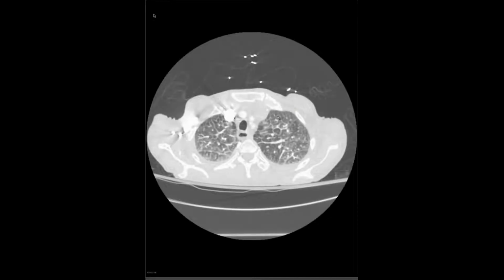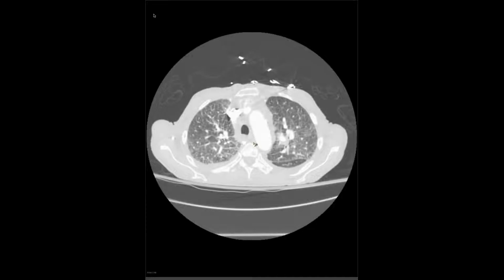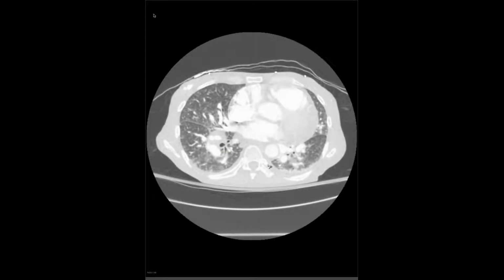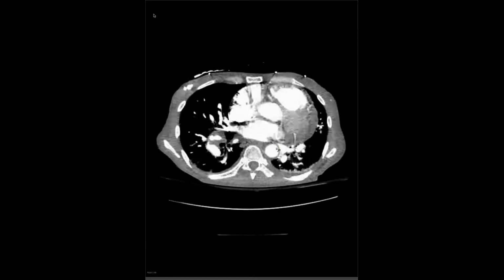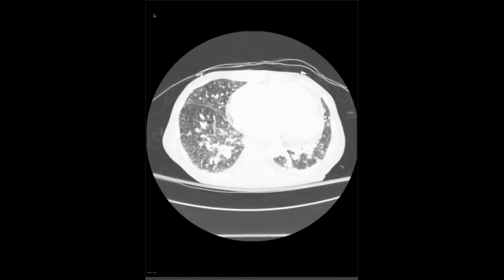And this is 2020, and she's been treated for a couple years with prostaglandin therapy, and she's got pretty extensive central thickened lobular septae, a little bit of fluid in the fissures and pleural effusions, and sizable mediastinal and hilar lymph nodes. And I think she might still also have these really tiny nodules.